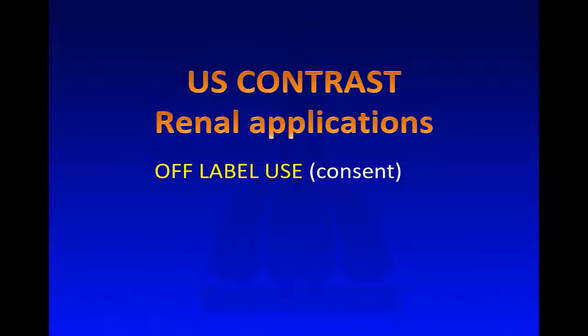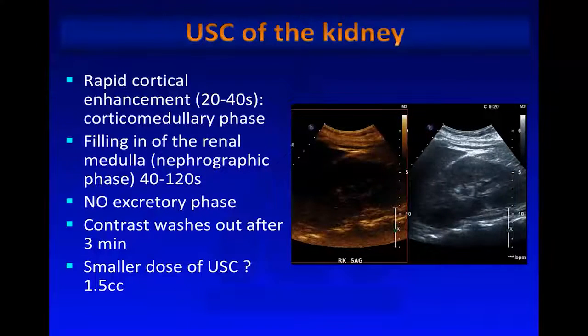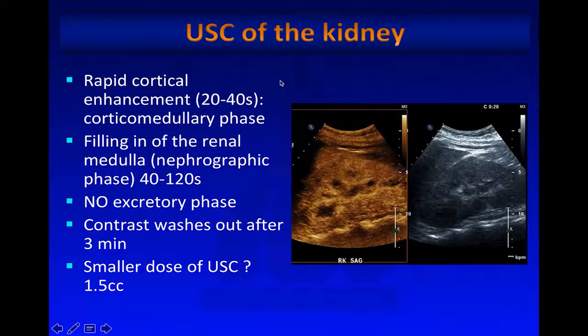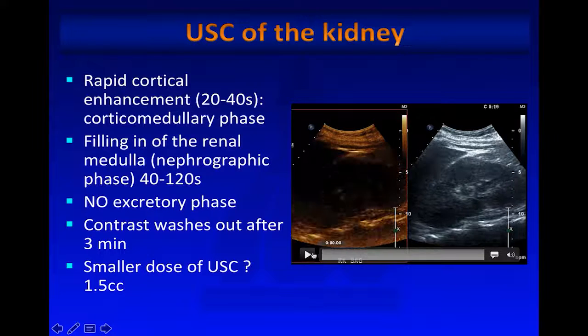Now let's talk about the other big application, which is renal application. So this is an off-label use, so you have to consent the patient and use your institution policy for off-label use of products. But I basically tell the patient, we use it all the time for liver, it's the same, and I've never had a patient say no to me. Anyway, so let's look at the normal kidney. And I'll start this clip again.